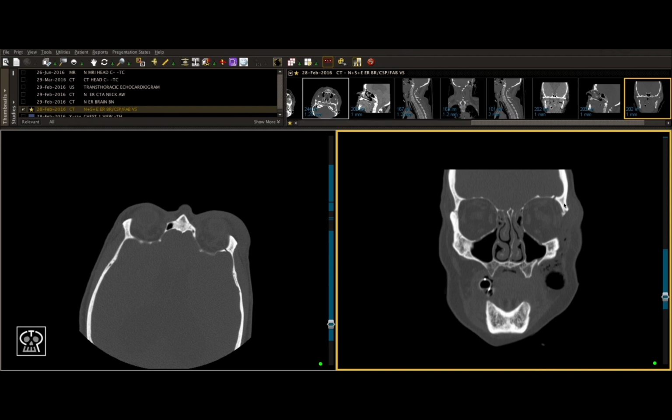As you can tell now, when you're approaching the scan, you're not looking for technically a ZMC type fracture. Rather, throughout your analysis, you're making notes of the different types of fractures you're seeing, and at the end, you're realizing it comes up with a pattern which represents a ZMC pattern type fracture. This is very similar to previously when we spoke about NOE fractures.